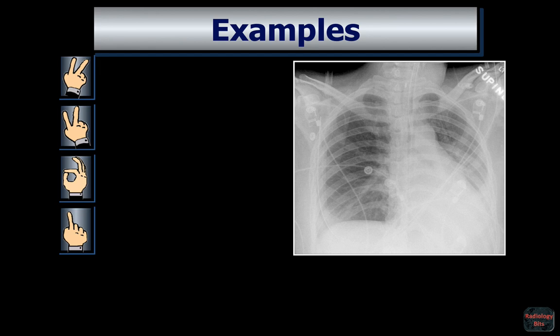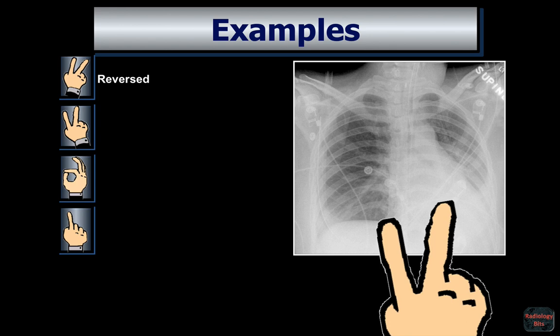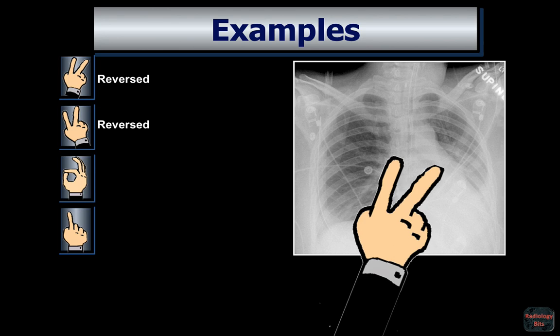Another example here. This is an X-ray on a sick patient in the ICU who has an endotracheal tube. Trying the first landmark, you'd at least suspect that the left hemidiaphragm is in a higher position than normal. Trying the second hand motion trick, although it's a difficult thing to detect, there is reversal of the tilt, meaning that there is an abnormal clockwise tilt of the hand motion sign here, denoting that either the left hilum is depressed or the right hilum is elevated.